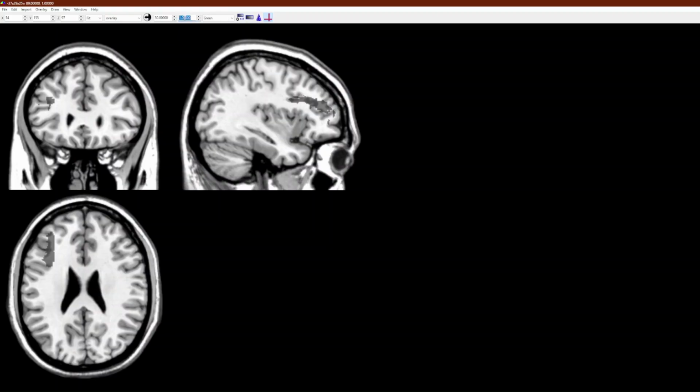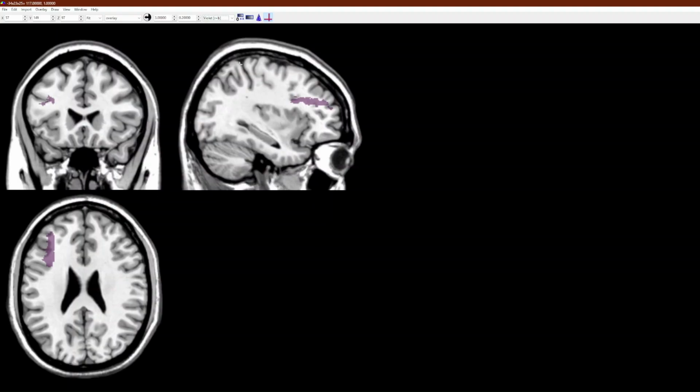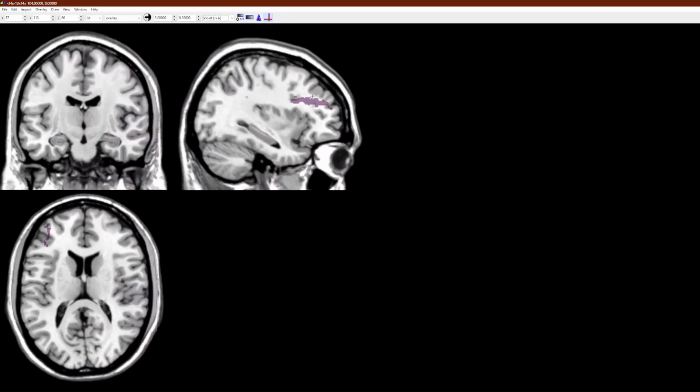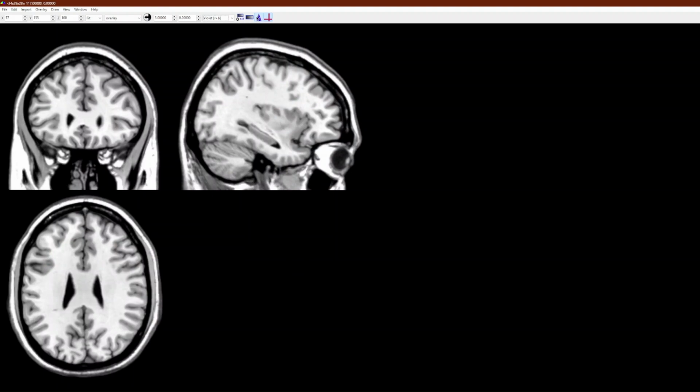Okay, yeah, so do 1, I'm going to do 3, or even 0.2. So that looks a little bit better. We can see the specific overlay right here. One other thing that could be useful is briefly hiding the overlay while going through the brain just to see any changes. One of the issues here is that you'll have to hold the wizard icon to do this. So if you look here, you can see it goes from 0 to 2.9.